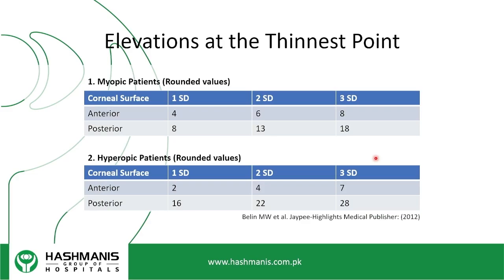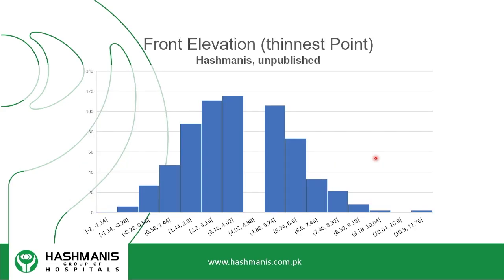These values you can memorize if you want, and a lot of people have done them, but these values don't mean much to me unless they're very high. These values don't mean much if you're looking at it from the perspective of refractive surgery. It's actually the maps that I'm looking at, the maps and the elevation data, and then the posterior progression that we'll talk about in the next few slides.